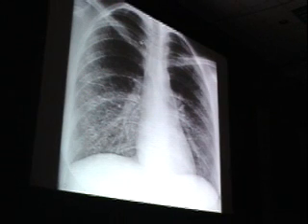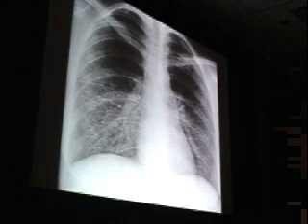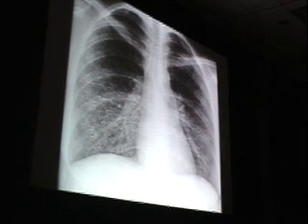Okay, next case, again, reticular nodular pattern throughout both lungs. One thing that I didn't point out to you as we were going along, and probably should have, is that by and large, when you have interstitial lung disease, it reduces lung compliance. So the lung volume is smaller. This is a case with diffuse interstitial lung disease and large lung volumes. These are pretty good lung volumes. That's a smaller and easier handled differential. In this particular case, we are looking at a case of eosinophilic granuloma.